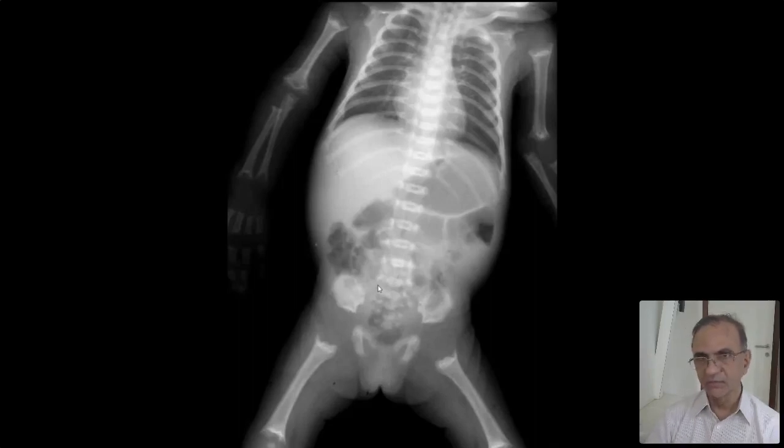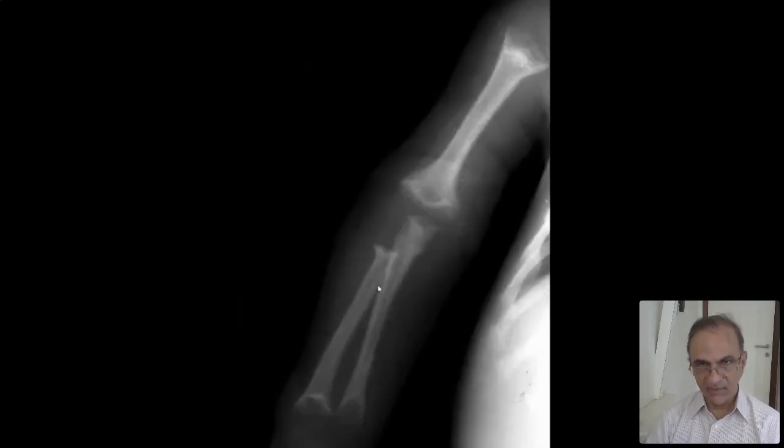So you have to look carefully. The phenotypic abnormality is a different thing altogether. But look at the radiograph and put this in your mind that the metaphysis is widened, agreed. There is no fraying and there is no brush border appearance and bone density is normal. 10th time I'm repeating because this is an extremely common dysplasia in our country and often mistaken. In fact, it should never be mistaken because it's characteristically abnormal and diagnostic of metaphyseal dysplasia. There are 7-8 varieties of metaphyseal dysplasia. Look up the books and read. But the first step is to make a diagnosis that this is metaphyseal dysplasia.